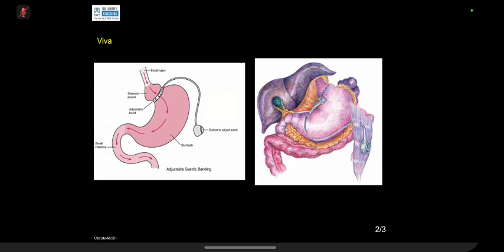Finally, rather the second last case, a bit about gastric banding. Gastric band surgeries, by the way, are now offered in the NHS. I'm not going to go into it; it's a huge subject, but I will show you just one case for your exams. The basic concept of the band is that we have an access port, an access line, and then this is the band. The take home point is that they can put fluid inside to constrict the band or to slightly open it up.